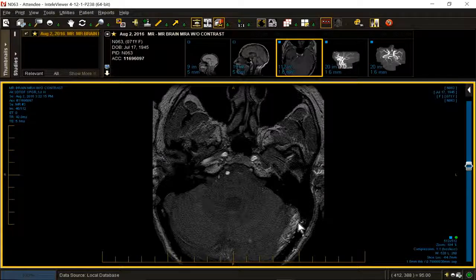In other words, they are draining retrograde in the sinus, but they are not extending outward. 2B, they drain into the sinus with reflux into the cortical veins, and they have antegrade flow. And then there are combinations thereof.